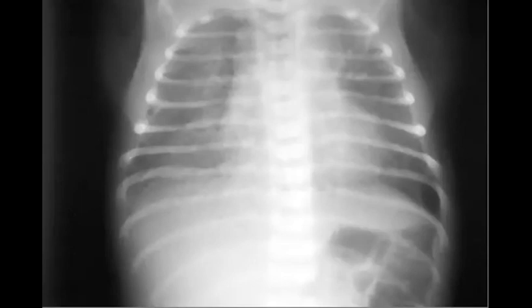You should note two things: try to figure out the age and the good or bad condition. Does this patient have, for example, any tubes and lines or ventilation? Then try to figure out if he looks like a very ill patient, or he looks good.